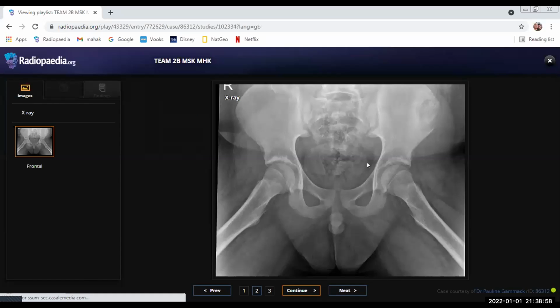Yeah, and this case I had kept as the edge of the film case. Like when I was watching it, I took it as, I think it's a bone. Then I took it like no, I have to see it. Yeah, it's a great case. Yeah. So this was Ewing's only, and the differentials were good.